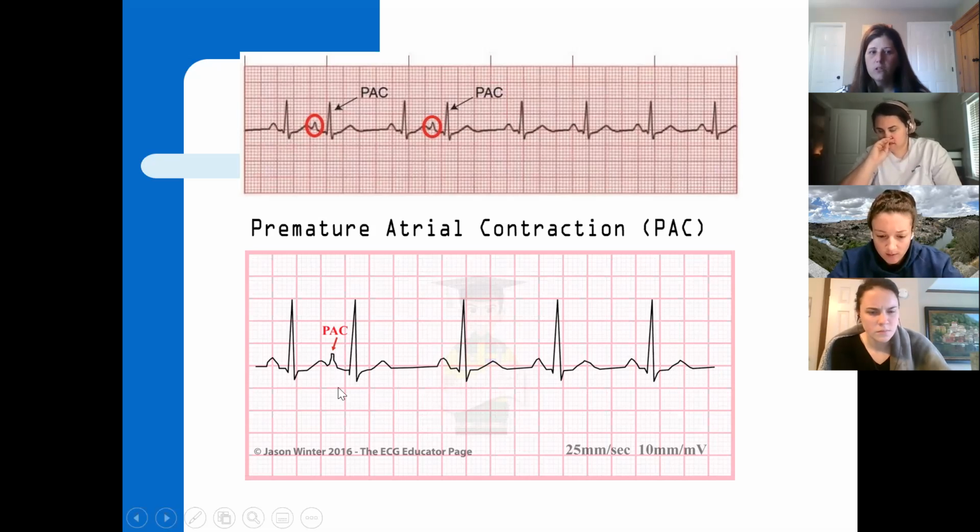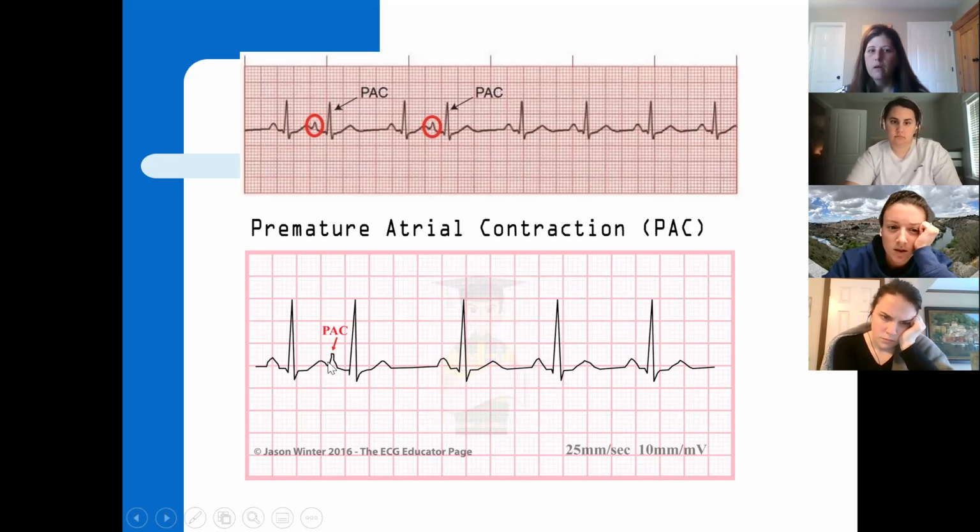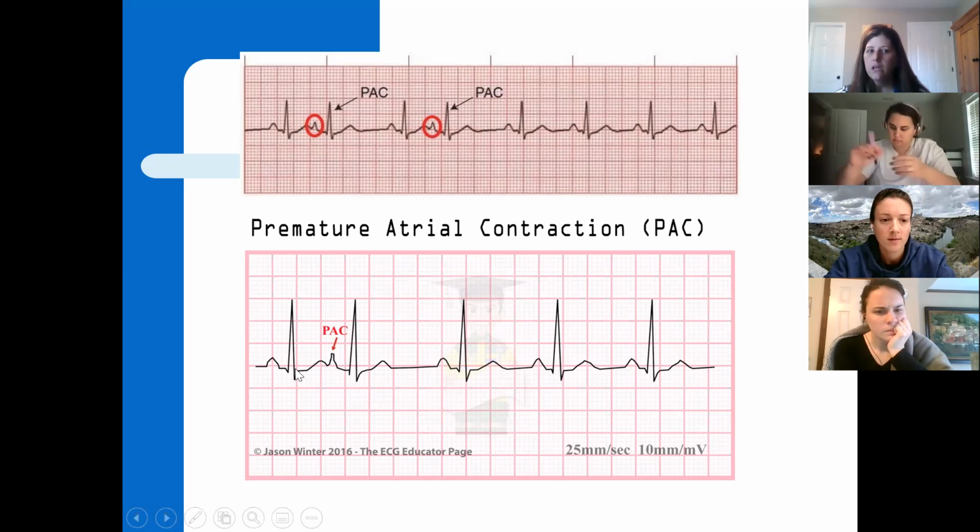This one we know does not look normal. It's jumping in early on the T wave. So you're going to be looking for something like this. The T has not had time to come back down to its isoelectric line and have a normal pause before the next P wave. The P is jumping in early, okay? But if you see, my QRSs look normal, okay?